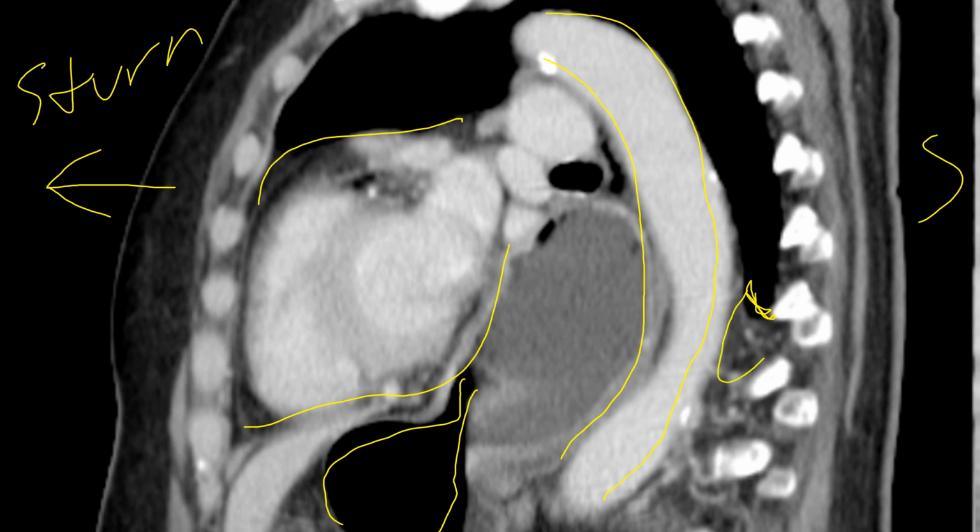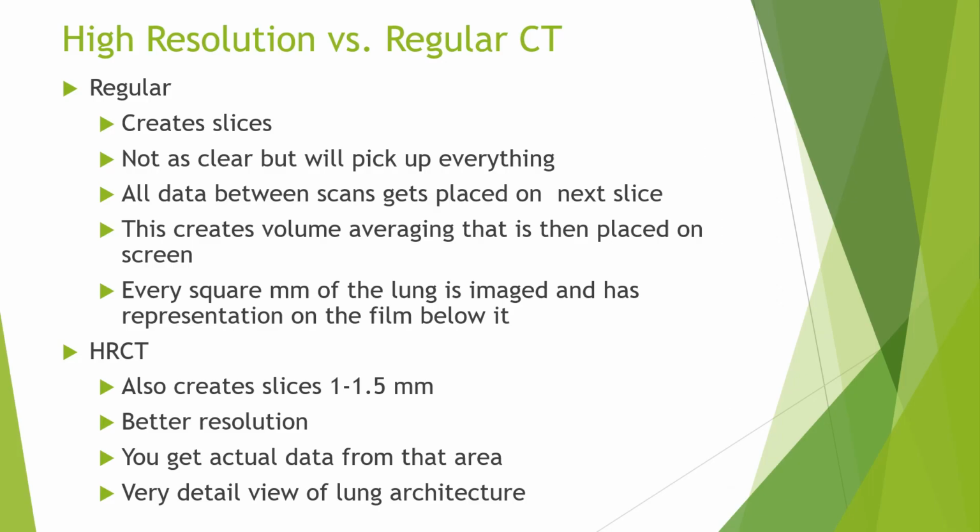That's that atelectasis and everything in there. You can see their pulmonary artery. You can see their descending aortic arch to descending aorta. You can see the heart. This can give you a lot better picture too of a retrosternal airspace for people that have barrel chest, like COPDers, right? Some of those chronic hyperinflation patients as well. So this can be a very important slide, especially when we're looking for alternate things as well. So if you see something like this, you sort of have a feeling of what you're looking at.